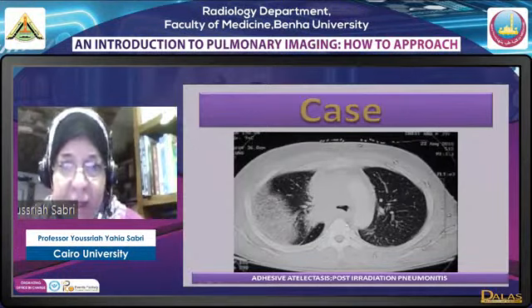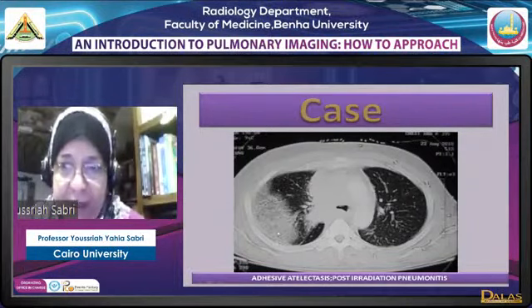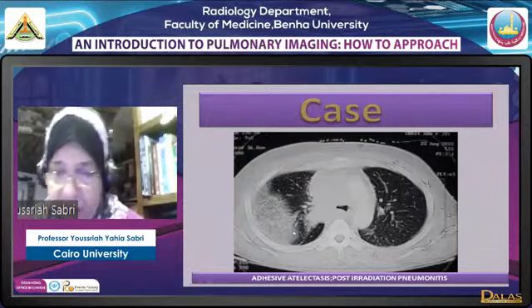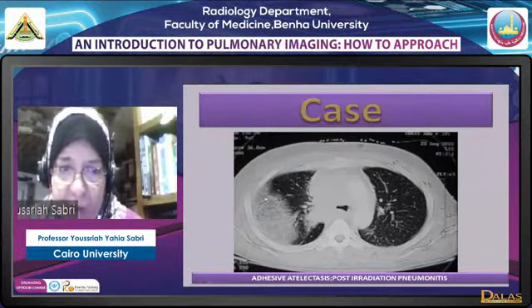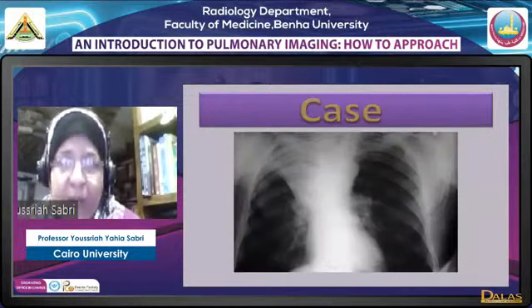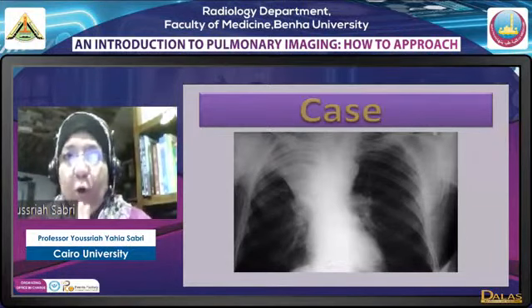This is a case of bronchogenic carcinoma with irradiation. And as you can see here, it is restricted to the area of irradiation. This is number one: it is peripheral in location in the lesion, not respecting the lobe. This is number two: actually, it looks like consolidation. However, pathologically, this is adhesive atelectasis. There are the four types of collapse: cicatricial, resorption, relaxation, and adhesive type. Now we come to an important item: how does lobar collapse look like?